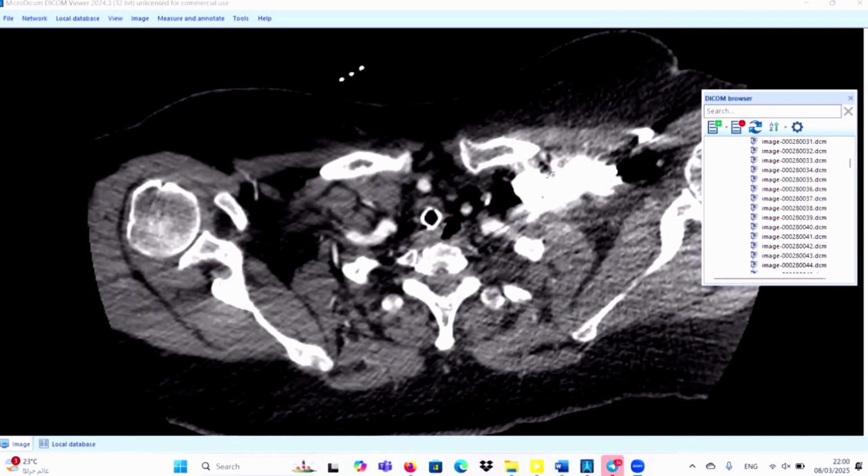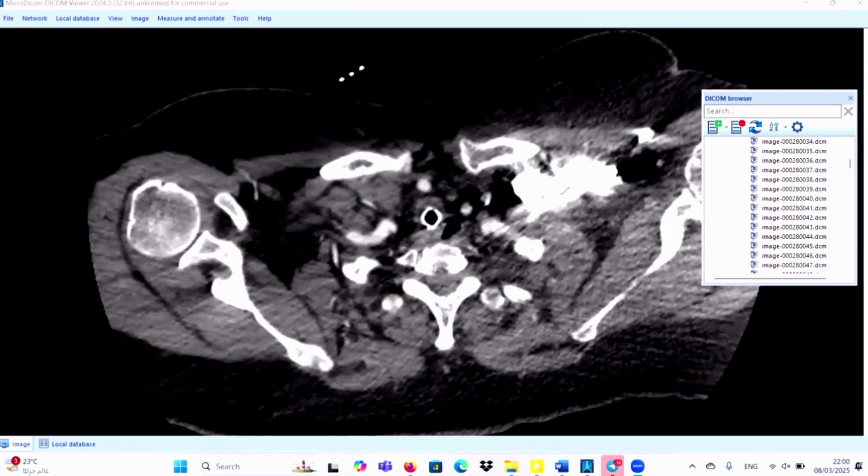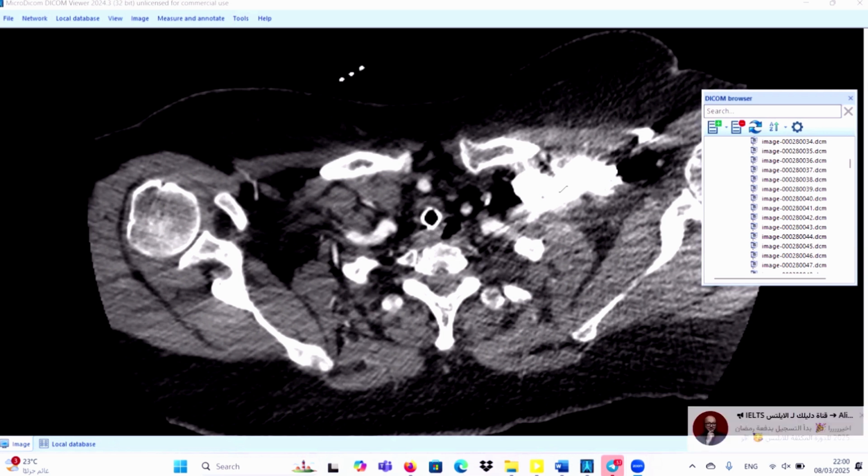It looks like a stenotic lesion in the common carotid artery, but really it is not a typical location. The typical locations for any stenotic lesions are the carotid bulbs, so we need to check again and again. If it is a real stenotic lesion, I think it doesn't cause significant luminal reduction. I think it is less than or equal to 50%. The significant stenotic lesion should be above or equal to 70% in luminal reduction.